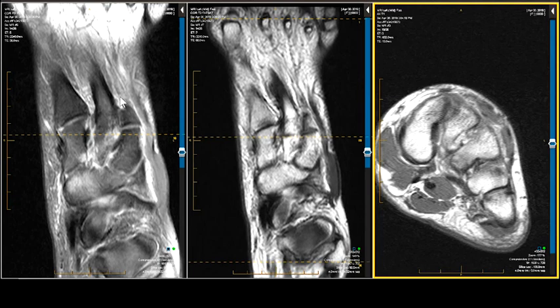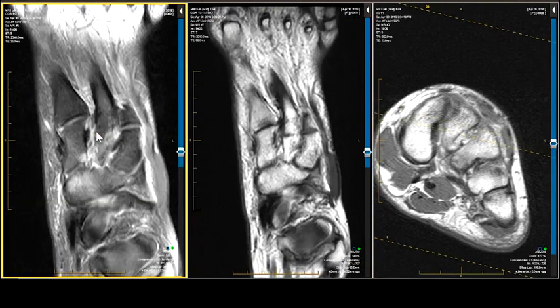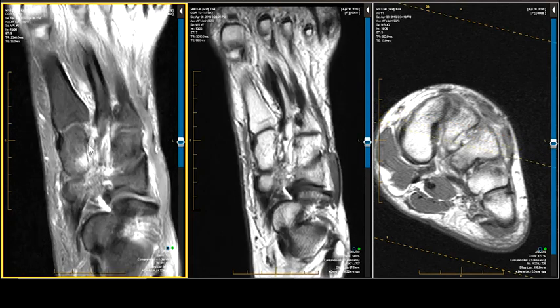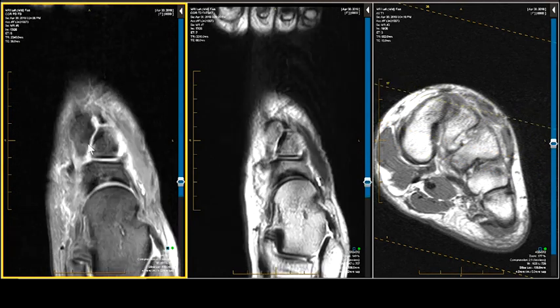That's not one. That's one of many. There's an end. There's an end. There's the butter knife that cut it. That's transected. Is the base of the second and the cuneiform wide? You bet it is. It's the isolated form of Lisfranc ligament rupture. Now, don't confuse the intercuneiform ligaments with the Lisfranc ligament. Now, the Lisfranc has three components. A dorsal component, which doesn't mean much at all. We don't care about it, but it happens to be torn. Can't find it.